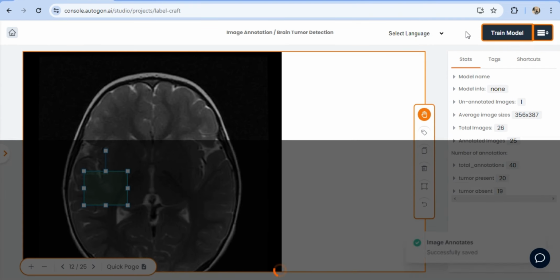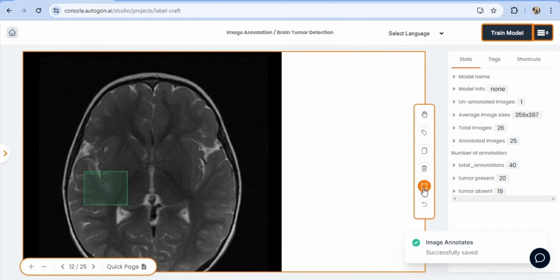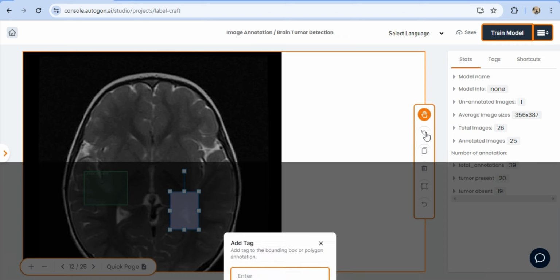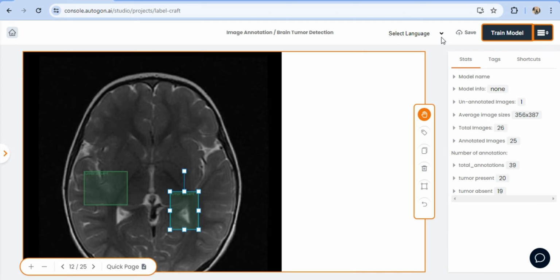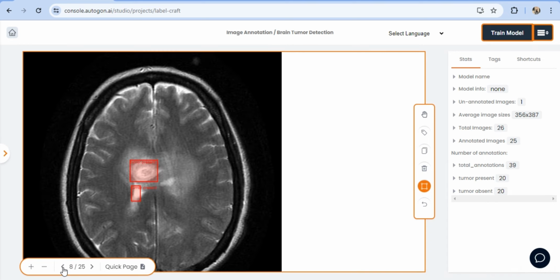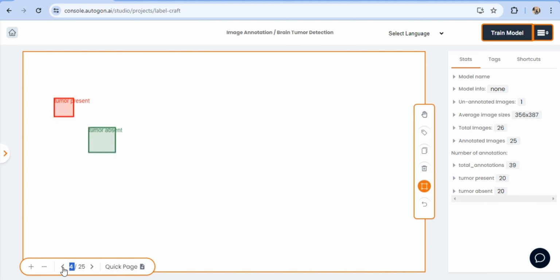This is very important. So I just came back here to check, and I had a feeling that I did not annotate this particular scan properly. And this is very important because I won't be able to train my model. I'm going to get that error flag. Make sure that every bounding box that you've created or you create always does have its own tag.